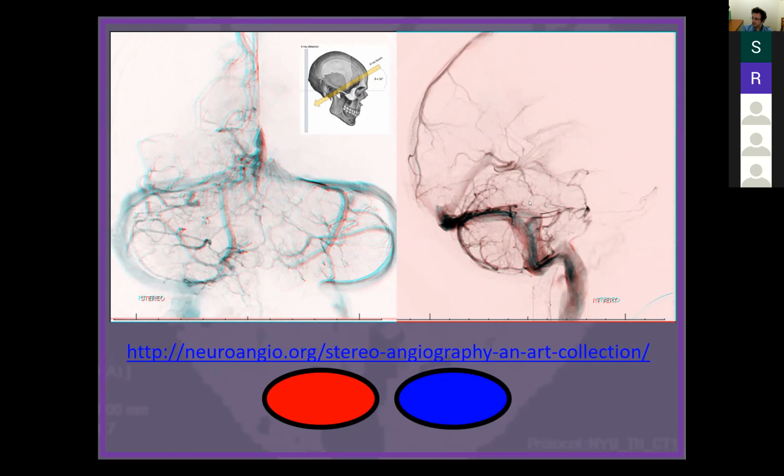So in the frontal view, we've been concentrating on the lateral, but in the frontal view, you can see the same structure. So here, it's a steep view, it's a Towne's view. In the Towne's view, what you try to do is open up this area. And what happens is the brainstem veins, the anterior pontomesencephalic vein, then project inferiorly. That's the structure right here.